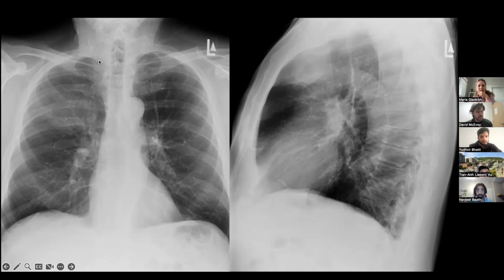So these are your apices, to make sure there is no pneumo hiding there, no apical mass. Next is the retrocardiac region, just because we tend to miss a lot of things hiding behind the heart that can look like they're the heart, but it's not just the heart. And then I take a look at my costophrenic angles, and lastly, anything subdiaphragmatic, which can tell us about something else going on with the patient.